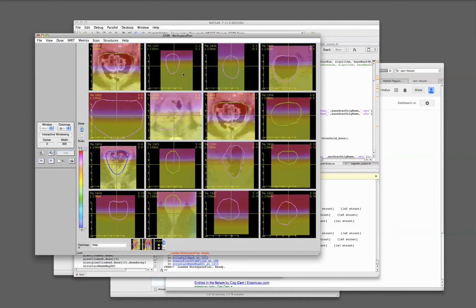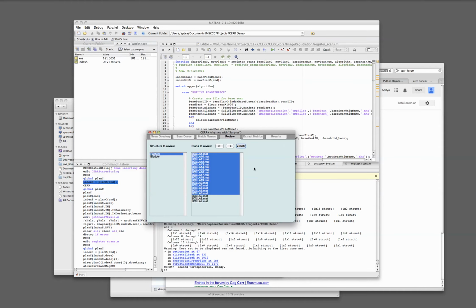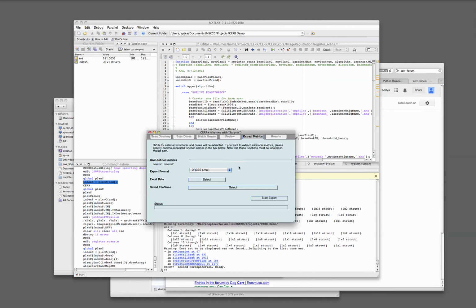When I move, all the rectums are moved by a specified physical delta value.